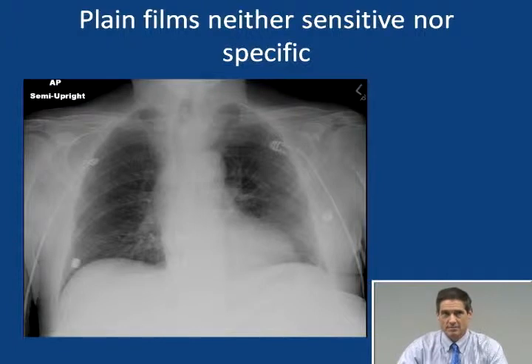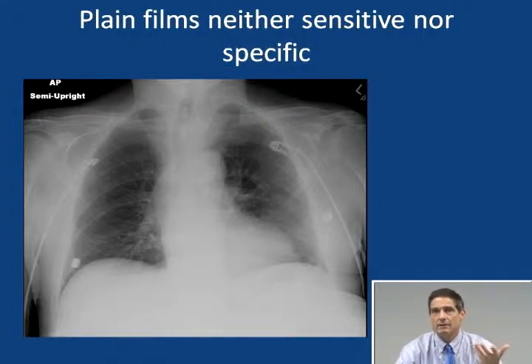Here's a chest X-ray on a patient with a pulmonary embolism that shows nothing. All these patients typically will get a chest X-ray, because all patients with chest pain typically get a chest X-ray. It's always obtained pretty much, and it is fairly frequently abnormal, but it's not often very helpful. And the reason for that is that at least one investigator found 84% of chest X-rays in patients with pulmonary embolism showed something wrong, but patients without pulmonary embolism had similar abnormalities at about the same rate.